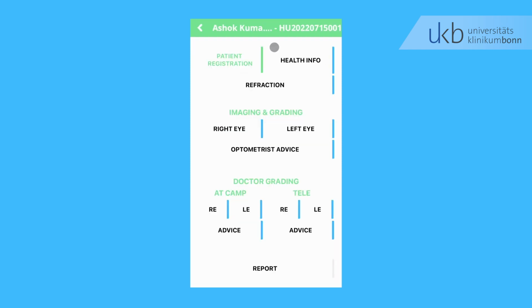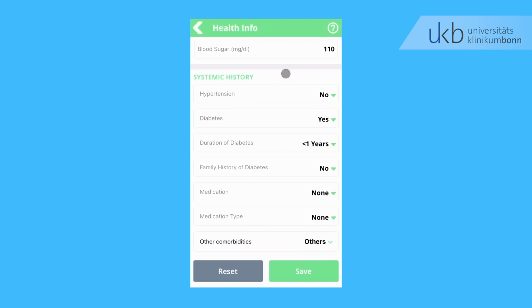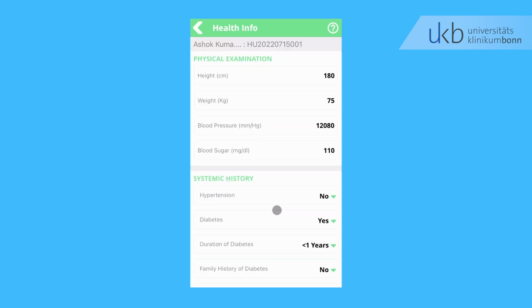In the second step, you enter the health info. This step is separated into the physical examination and the systemic medical history. This data is not required to proceed, but it will be very helpful for the final assessment of the patient.